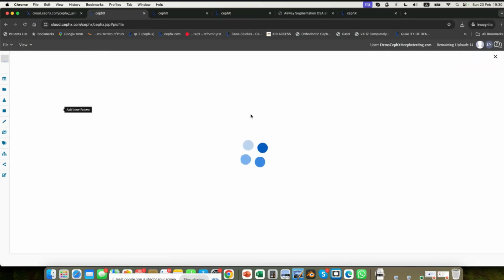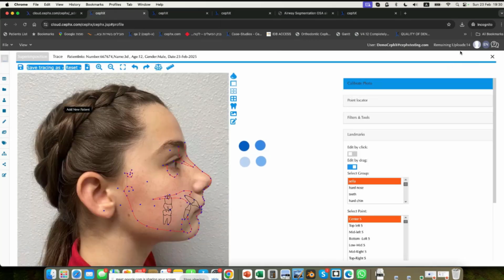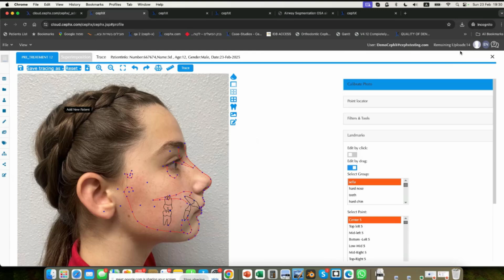And the same for profile, same immediacy. With regards to 3D, that's already a longer process because it's heavier files and more compute power. It can take very much depending on the file size. We've seen CBCT scans that are 50 megas and CBCT scans that are like a gig. So depending on that, it can take between a few minutes to, I don't know, half an hour, something like that, on the real edge of the spectrum.